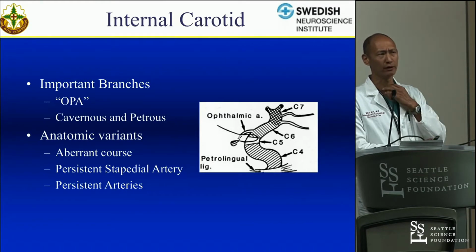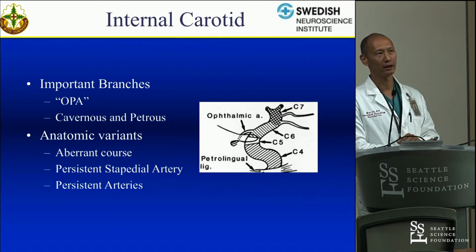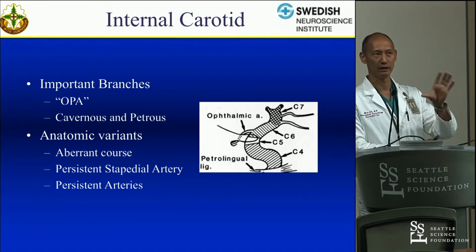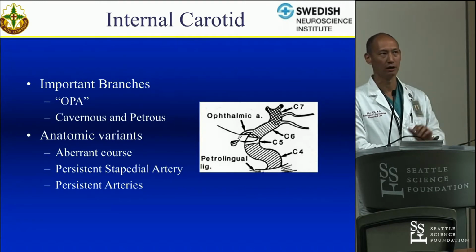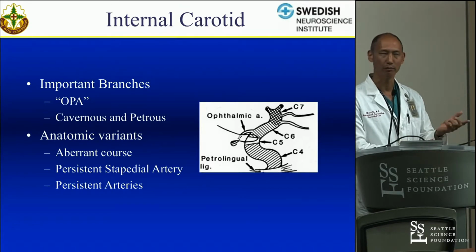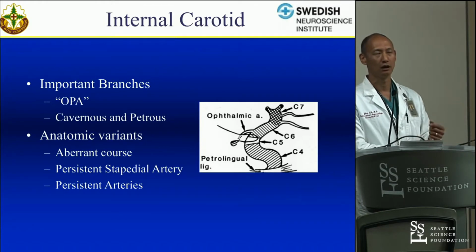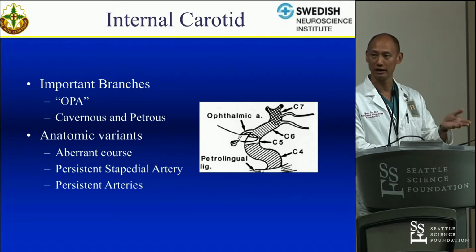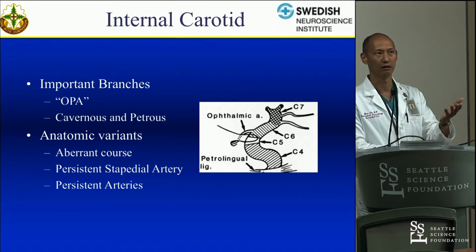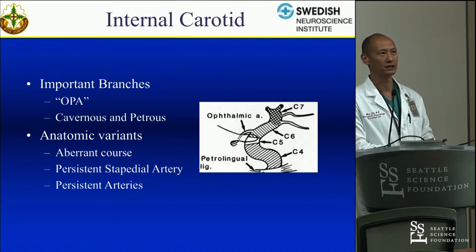I forgot to mention in the aberrant ICA, the inferior tympanic artery then connects to the carotid-tympanic artery, and that's how the external and the internal then form the internal carotid artery in whole. So that carotid-tympanic artery is an important branch because it's essentially a vessel that regresses but can show itself again. It usually originates in the petrous bone. It can show itself if, for instance, a fistula exists, then that artery may actually grow.